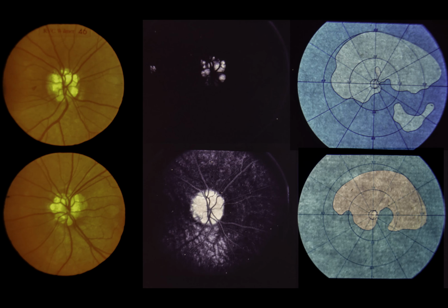Slide 46. Optic disc drusen and progressive visual field loss. This 31-year-old male noticed progressive difficulty seeing with his right eye. Upper left and lower left. Both optic discs contain multiple glistening yellow drusen. The retinal vessels have an abnormal branching pattern on the disc surface, and no peripapillary retinal nerve fiber layer is visible. Upper center. Fluorescence of drusen in the right optic disc prior to dye injection illustrates the phenomenon of autofluorescence.